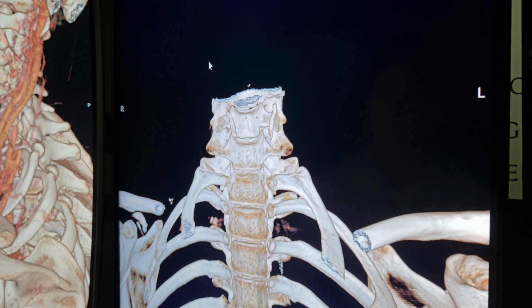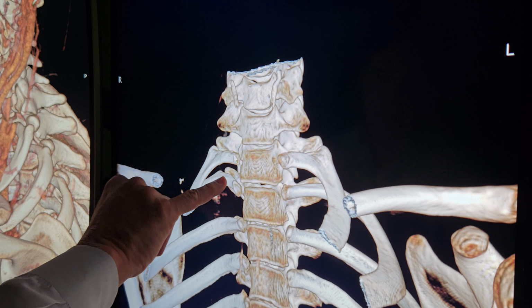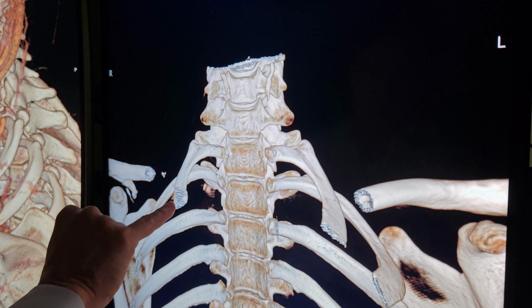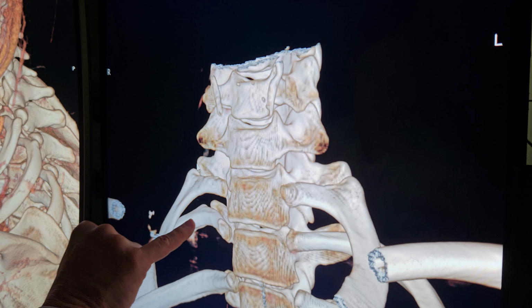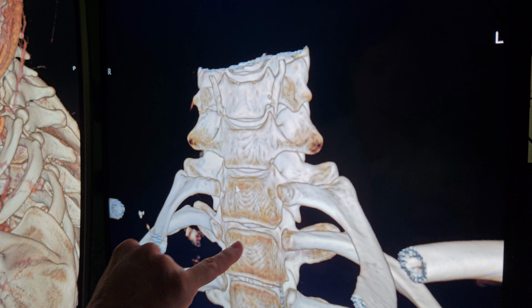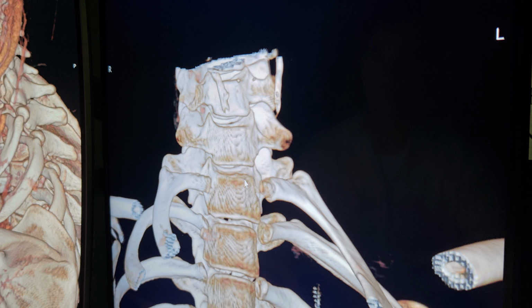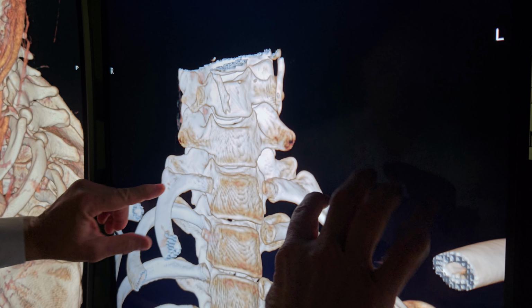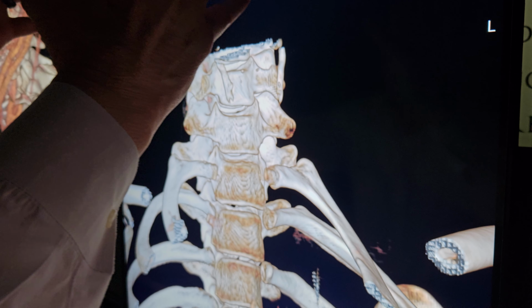Okay. All right, so here you can see the first rib on the right where it's sitting. You can even see that it used to sit right up in this little socket there. And you can see that it's sitting right there below the edge there. And it's actually on both sides. And one of the reasons we care about this is that the scalene muscles attach to the first ribs, and they are very important for stability of the cervical spine.